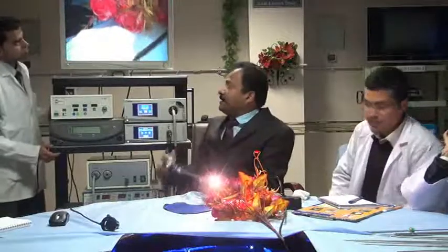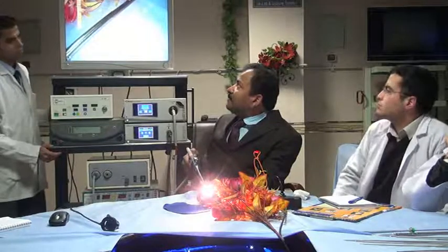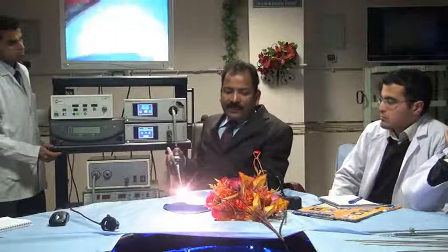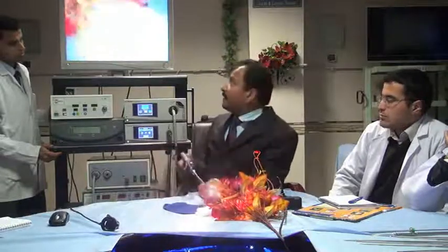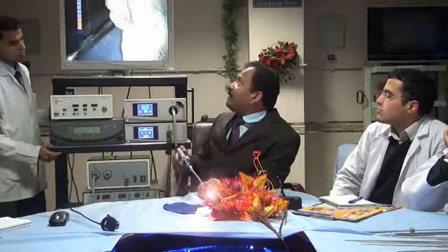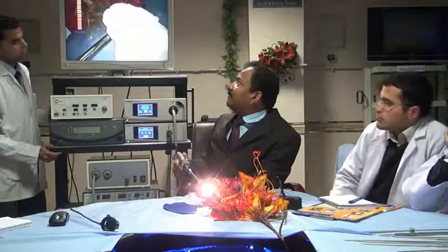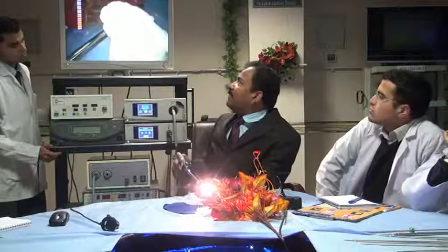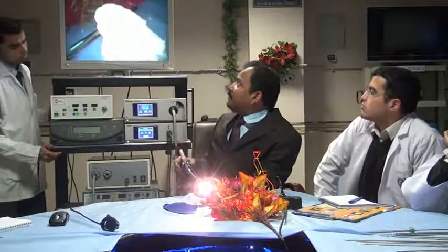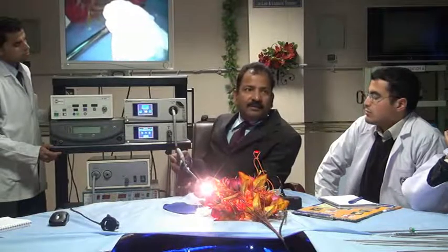You will just see that, if I have to increase the light, this is more light. But sometimes more light has a problem, it will create glare. Here this is a glare. Now I should decrease the light. With this button only I can decrease or increase. The camera will decrease your sensitivity. See here, this is the shutter. Now you see here, the image is not crispy.